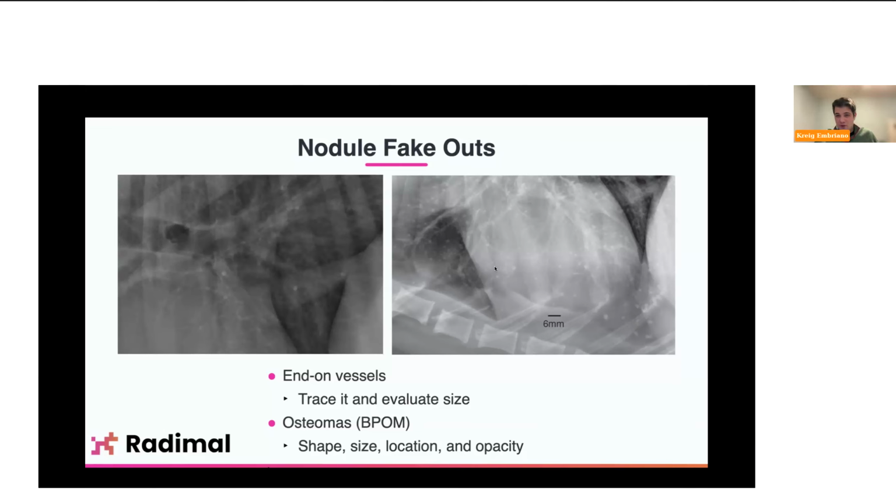They're usually this small. They usually hang out in the periphery of the lungs. Occasionally, I should say rarely, you'll get ones that are quite large, and those have a more jarring look to them. But those are pretty rare. And so usually they're these small, a few millimeter sized. Here's a legend of 6 millimeters for comparison. So they're between 1 and 3 for the most part.